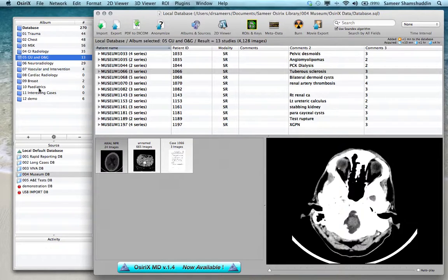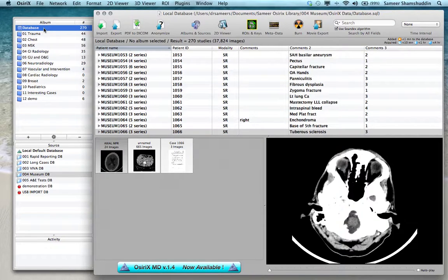So how do you create a new database? Think of a name that you want to give the new database before you actually create it. To create a new database, you need to create a new folder, and that's a very important, crucial first step. If you miss this step, you will not be able to create a new database.